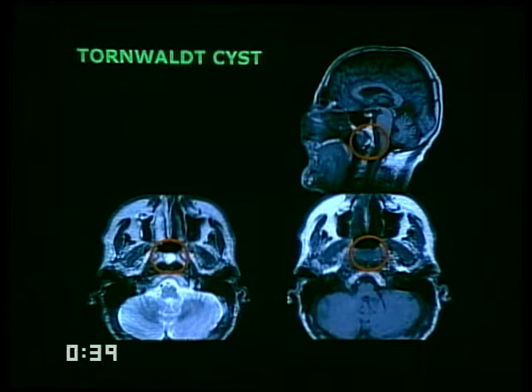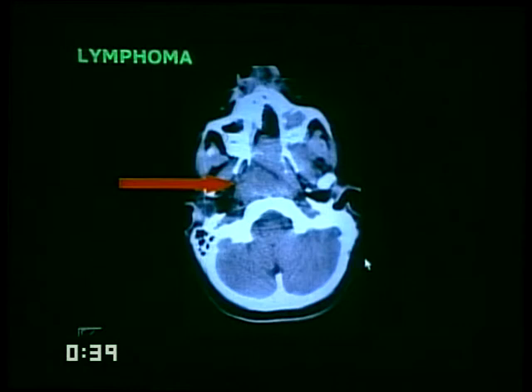So whenever you see this, the critical thing to evaluate is whether you can see a clear fat plane between this structure and the longus muscle on either side. That has surgical importance. Remember, it's a very common lesion.